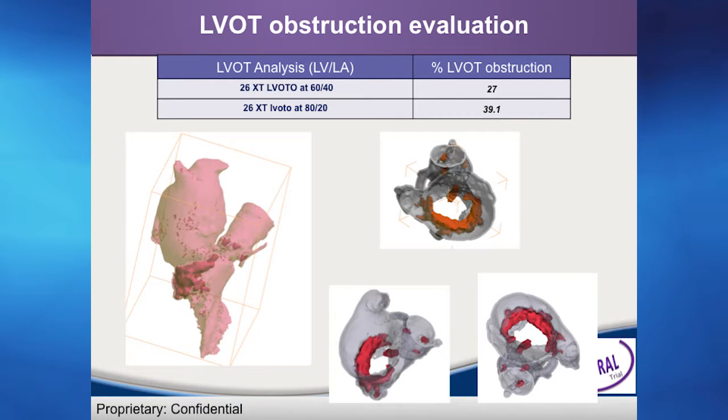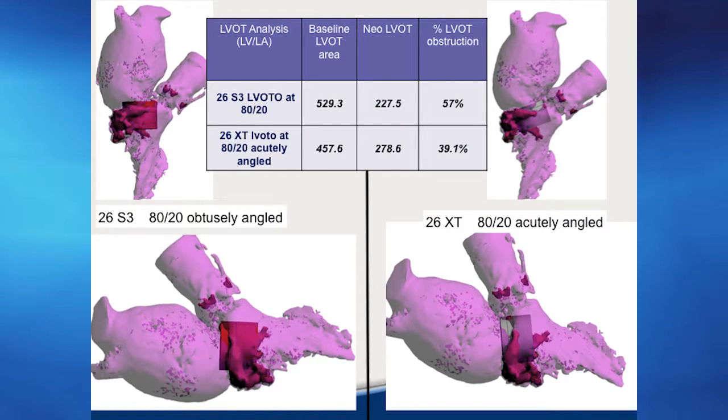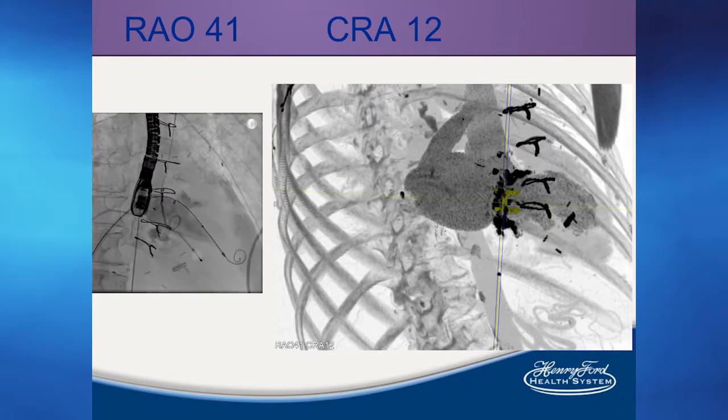Here's another representation again, giving you another idea of what you're dealing with. And in this patient, we have limited control of where you put the valve. Sometimes it's a little further ventricular, sometimes a little further atrial. But after going through a lot of calculations, we can give ourselves the probability it's going to obstruct and what our chances are, and what's the best way to deploy it.